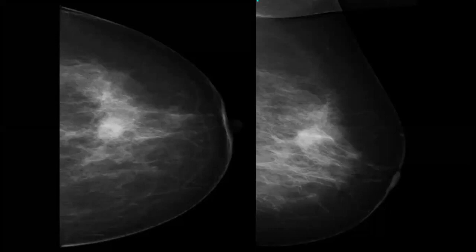Okay. Continue. Look, Abir and Sarah. You will think that this might have a convex border, but look at how it is elongated here. It persists a shape.